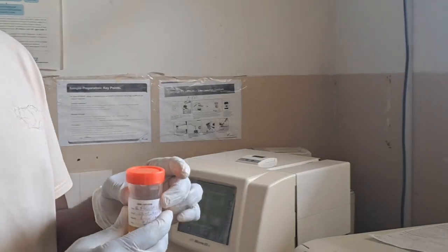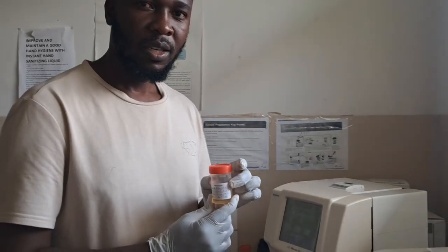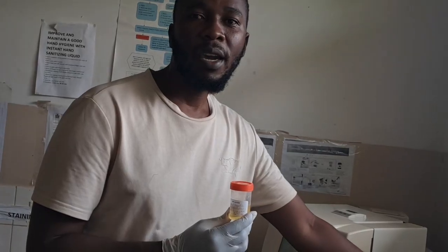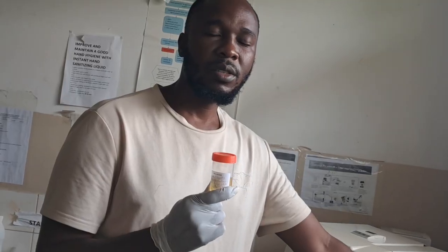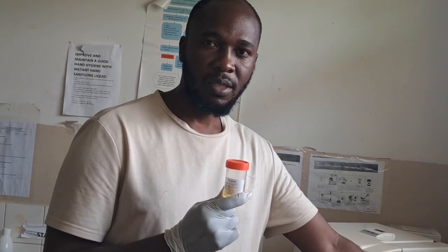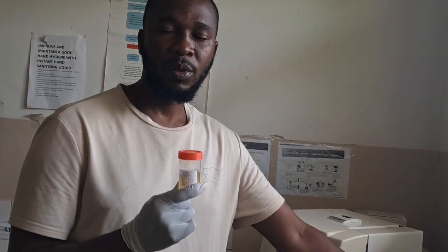Because for urine, we are still on storage. When you're keeping urine at room temperature and you don't have a fridge, you have to test within 8 hours. That's where time comes in. Sample collected around 10, by 18 the sample should have been processed. If you have a fridge with a temperature of 2 to 8, the samples can be stored there for 3 days. More than 3 days in the fridge at 2 to 8, that sample is not viable anymore. It can give a false negative or a false positive.